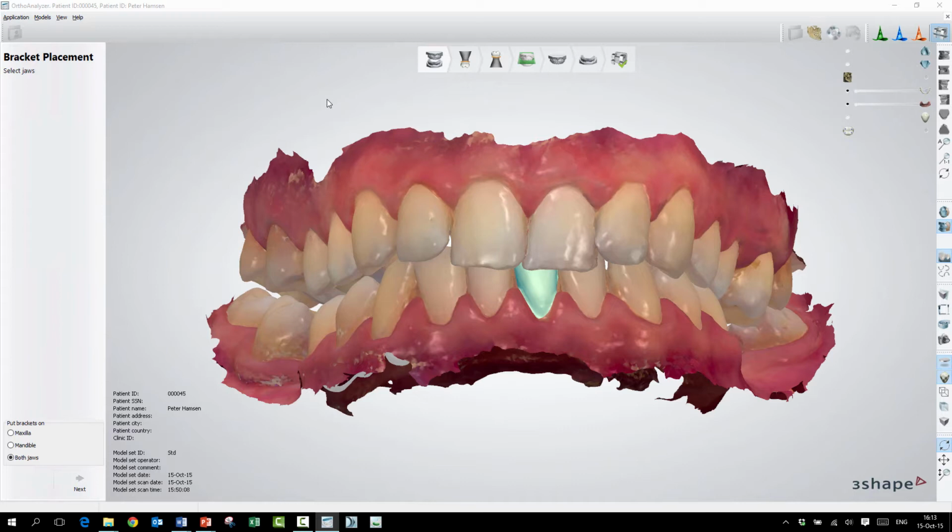Right. So for example, aligners on the upper or lingual brackets on the upper, and then vestibular brackets on the lower. So this is really a module that will allow you to place brackets on the vestibular side of the teeth of the patient and on the malocclusion. So what we mean by this is that there is no adapting to the arch or virtual setup functionality yet. It's purely on the malocclusion of the patient as he or she is at the start of the treatment.